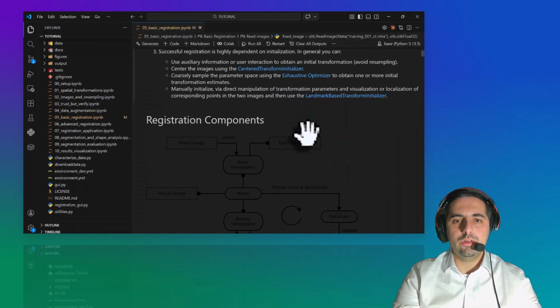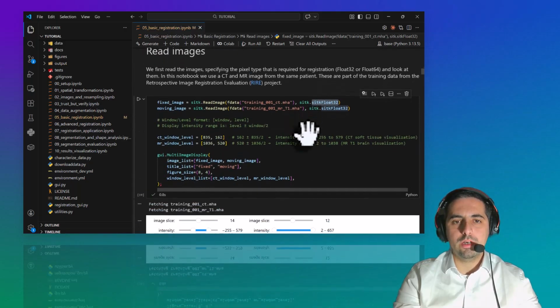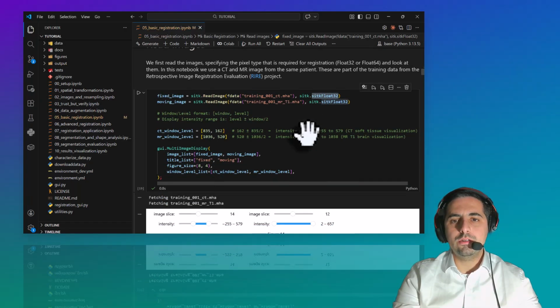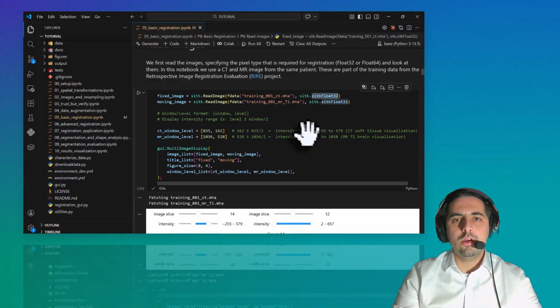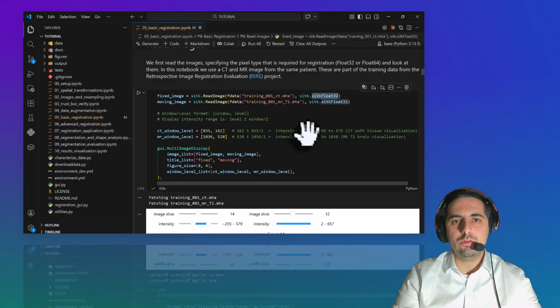My goal in this video is to explain the registration step by step. So again, what is the goal of the registration? When we perform a registration between volumes of medical imaging, and the same thing when we perform a registration between two 3D point clouds, the goal is to get a transformation matrix, which is a 4x4 matrix, and contains a 3x3 matrix, which is the rotation part, so 9 elements, and the translation part, about 3 elements. Okay, so we need to find them.